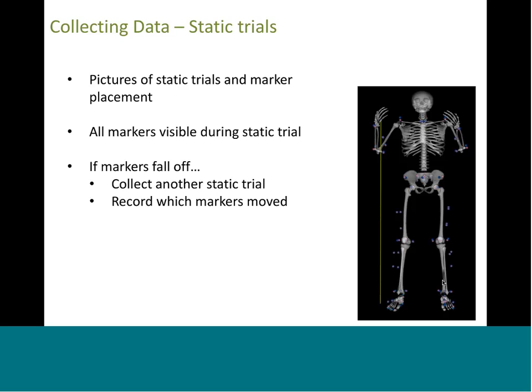If your model is defined by your markers, losing markers is a huge issue when trying to have consistent joint angles throughout an experiment, but it's less of an issue in OpenSim due to our model. You can always replace the markers using marker registration, but even if you forget to collect that extra static trial, as long as you know which markers moved, you can always just reduce or eliminate the weighting of those markers. Again, this demonstrates the usefulness of redundant markers.